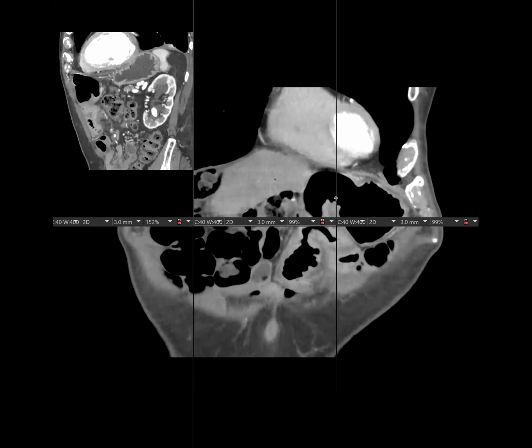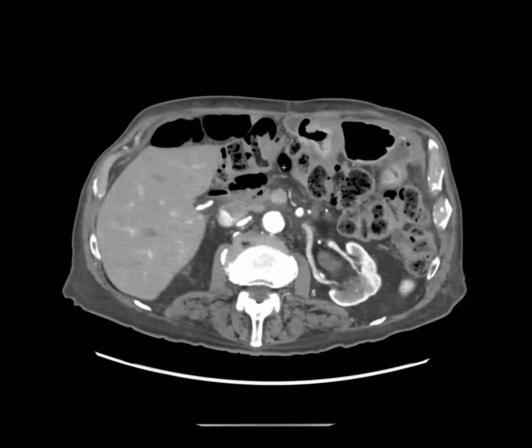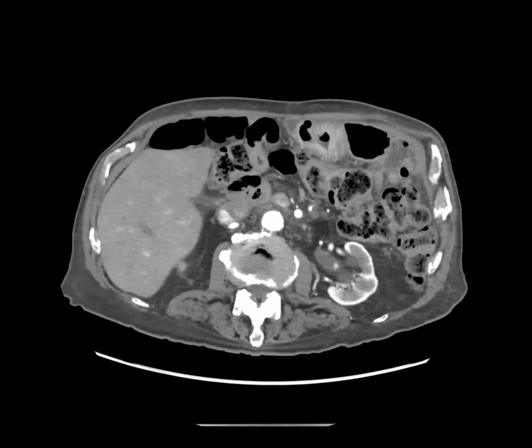And yes, I thought this was a really great pickup on CT of a marginal ulcer, which can be a complication of GJs. A couple of things. They can present with bleeding, sometimes nausea and vomiting, and we usually see this in the early post-op period.